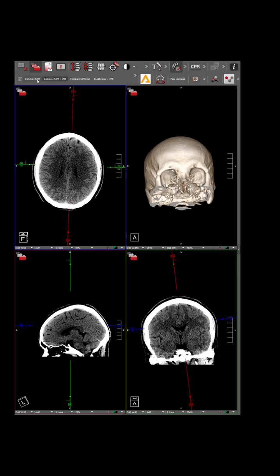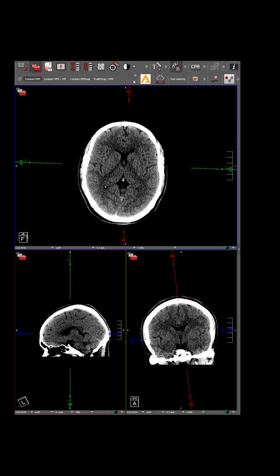I've been asked frequently if you can design your own hanging protocols, and I've spoken to the Visage engineers and the Visage team. Typically, as far as I understand, as far as they were able to tell me, you are not able to create your own very bespoke hanging protocol, save it, and then load it. You have to basically find what you want through these, and then save, rearrange, and then set as default. There are ways to work with Visage to create very specialized hanging protocols, but that is not something that end users are able to do.